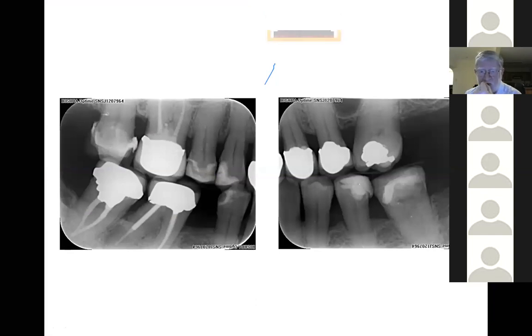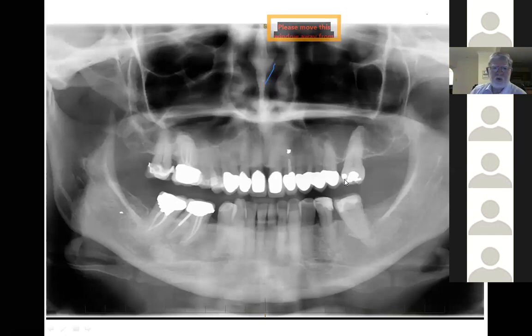So seeing a patient for the first time, taking bite-wing radiographs, there's an Emax crown there. Somebody hasn't cleaned up the cement after that was cemented on. Take an OPG because there's a lot of endodontic treatment being done, lots of crowns, a lot of bigger work, and we want to see what's going on. So what do you see apart from that we talked about? Two things mainly in the upper arch. Okay, 2-5 PA pathology.